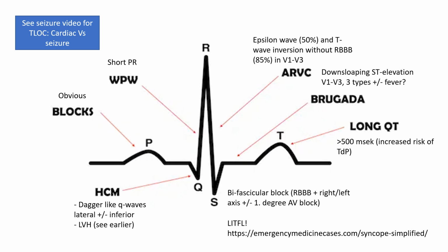And then you go on to the other side of the QRS, where you have the opposite, what you call the epsilon wave. It's called epsilon wave because you have a delta wave here, and on the other side you have epsilon, since delta in the Greek alphabet is followed by epsilon, right? So that's why he named it epsilon, because it was on the other side of the QRS complex.